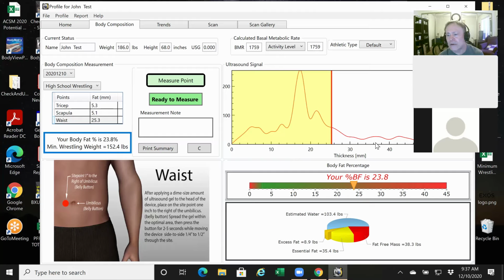Okay, so here's the outlying scenario. I'm going to go ahead and move this peak back. We'll adjust it back to where it should be. All right. So I had an assessor call me and he said, hey, I've got this gentleman. He's 5'11 and 360, big kid. And he was having difficulty even getting a measurement on him.